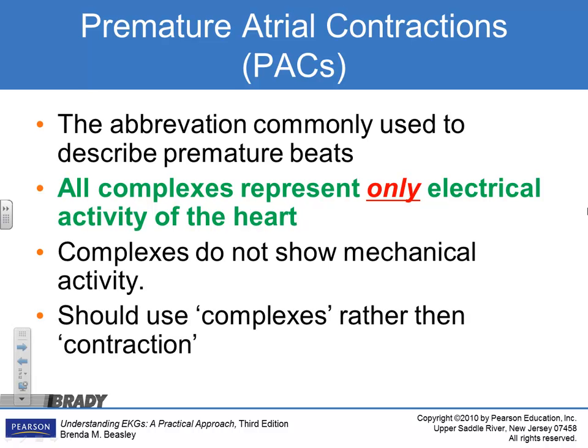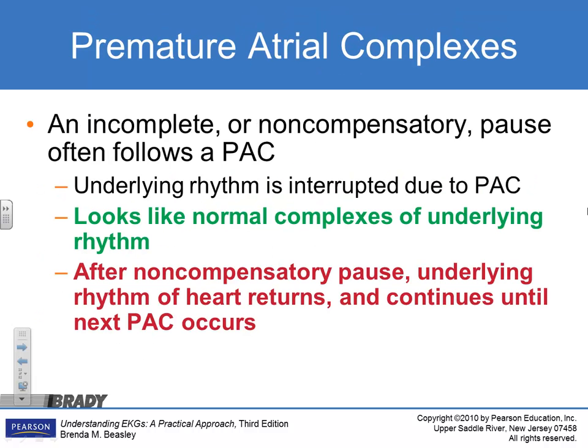We should call all these complexes, like PACs, we call it contractions, but it really is a complex. It's a premature complex, so we'll look at those here in just a second. And after you have the PAC, there's usually what they call a non-compensatory pause, where there's kind of a pause before the next one starts back up. The underlying rate is usually going to look like a sinus rhythm, because it is a sinus rhythm, with these occasional thrown in ectopic beats. So we'll look at this.